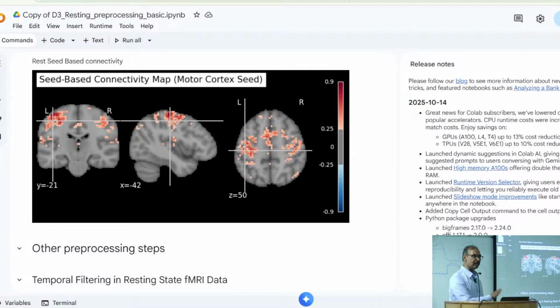I haven't done any filtering. When we do filtering, the result becomes even better. So now try for the next half an hour by changing the coordinates. It would be good to save the screen, what coordinate you used and how the image looks. Try many different coordinates. If you can, also try to use the visual cortex.